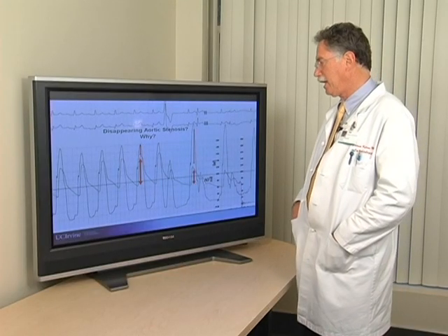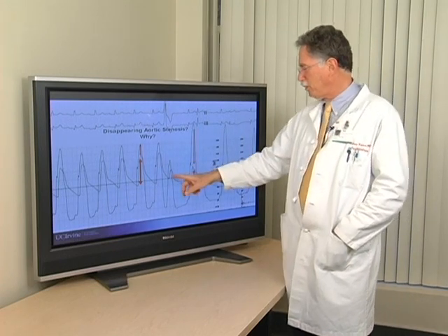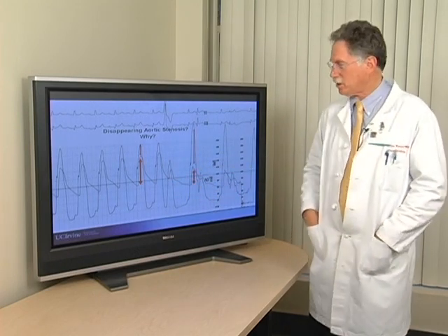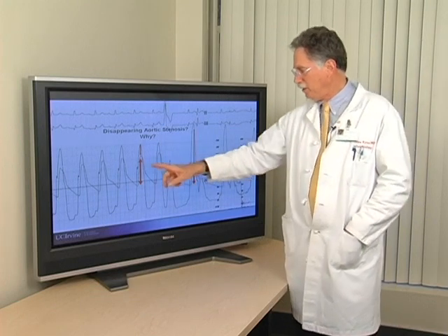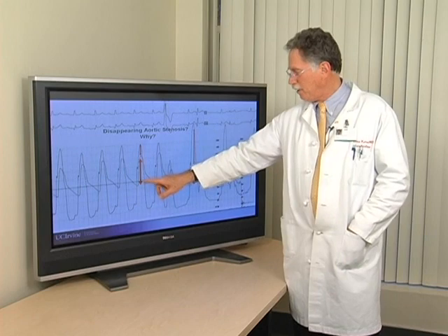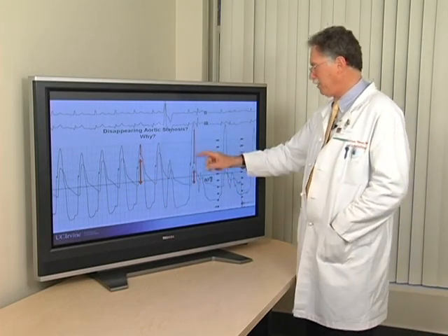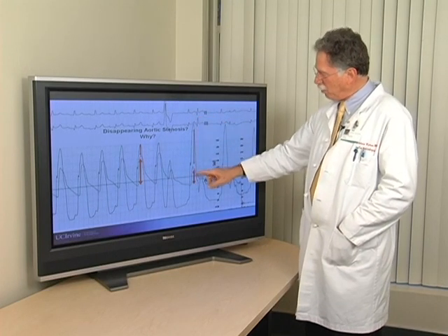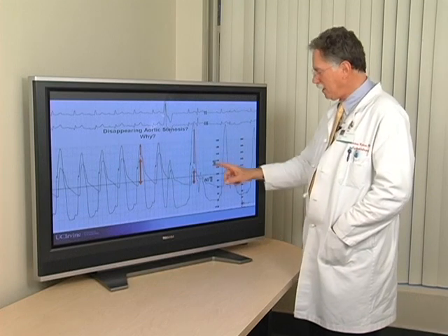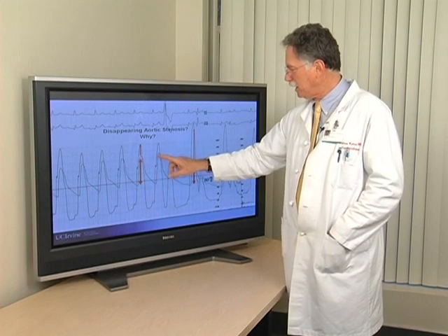Now on our basic hemodynamics, just a few moments ago, we talked about the findings in a post-PVC beat of the gradient related to aortic stenosis. Let's take a look at this one. Here is another tracing with an aortic LV gradient and a pulse pressure indicated by this big arrow. On the post-PVC beat, we see a very big gradient, but we see a smaller pulse pressure and a change in the waveform of the aortic pressure, and notice that the upslope of the aortic pressure is not delayed.